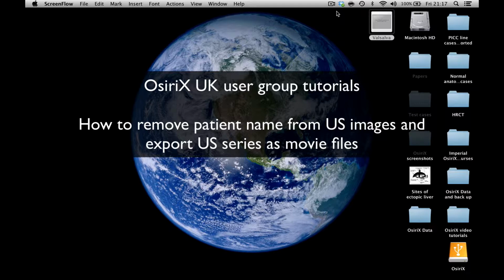And what I want to talk about today is how to get rid of patient identifiers from ultrasound images that you have imported into your OsiriX database for teaching purposes or possibly for publication.